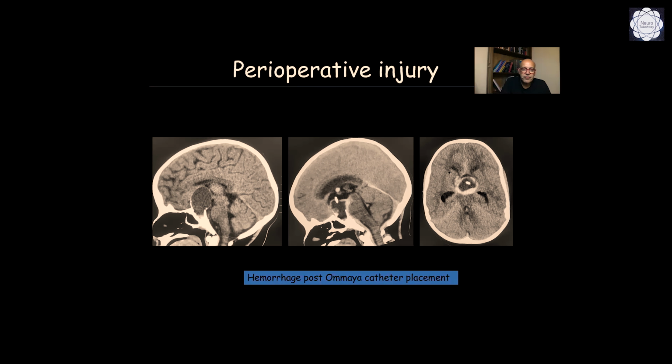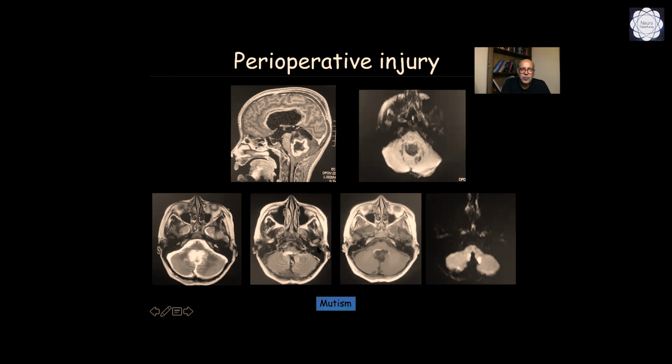for this tumor. But in some cases, as in this one, the wall of the cyst has calcifications, and so when the catheter traverses this wall, it produces hemorrhage around the wall and in the subarachnoid spaces. We have to be ready for these complications in these cases.